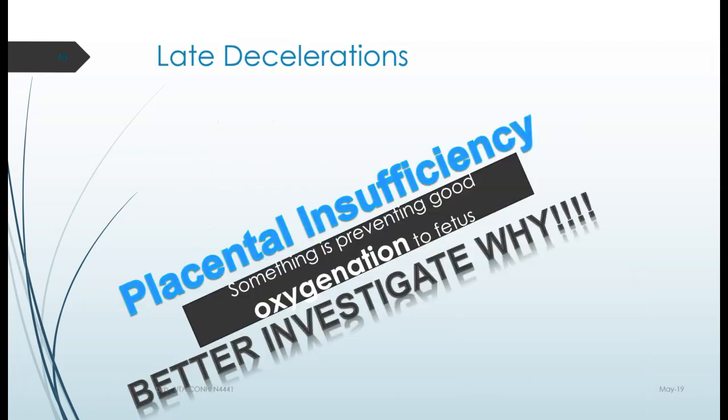I'm going to give you a hint on how to remember these in a minute. Just walk with me through these and get these understandings, and then I'm going to show you an easy way to remember these. A late deceleration, remember, returns to baseline after the contraction is over.